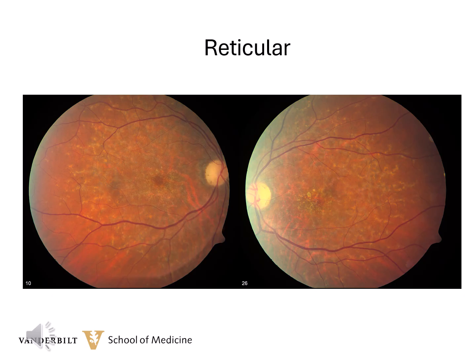This is a patient of Dr. Don Gass, who had vision of 20/50 in the right eye, 20/400 in the left eye. The yellow lesions are more like a radiating butterfly pattern, but there's also a very coarse pigmentation. So as with many diseases, there may be a little bit of overlap on the clinical picture.